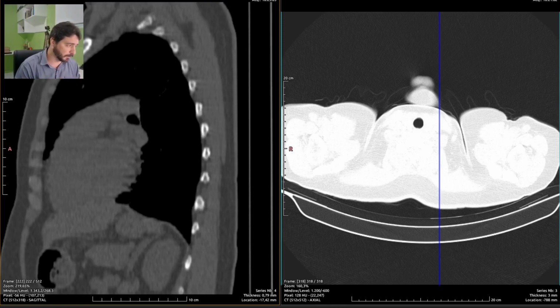I guess this is the motive, after all, of ordering this CT scan. So I actually say this on the summary of the report, that there is no sign of acute pulmonary disease. So everybody goes home happy.